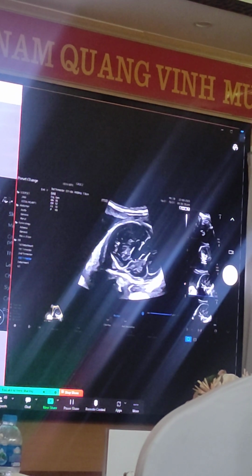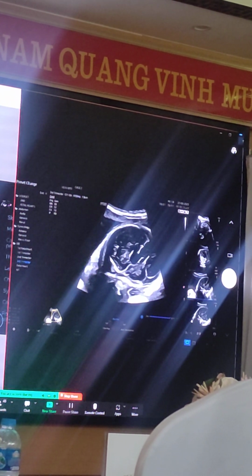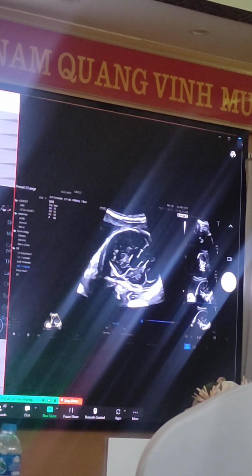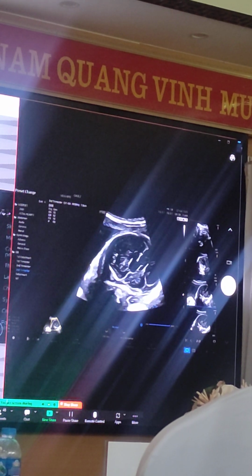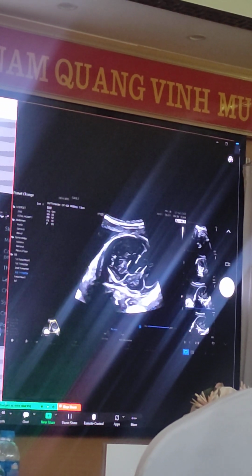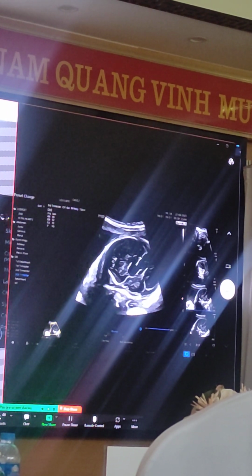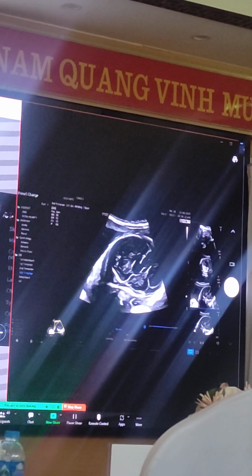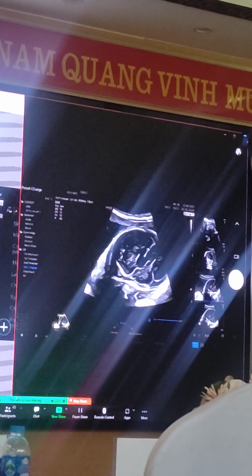But you can see here small peaks. There's one here, the other one was there, but it's a moving image. These are the olfactory bulbs, so you check that not for, you don't worry about that in 22q things, but you do care about that in CHARGE syndrome. So the fact that you can see the bulbs is not excluding the diagnosis, but it makes CHARGE less likely.